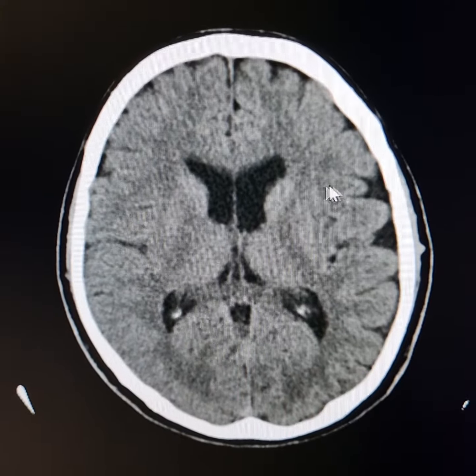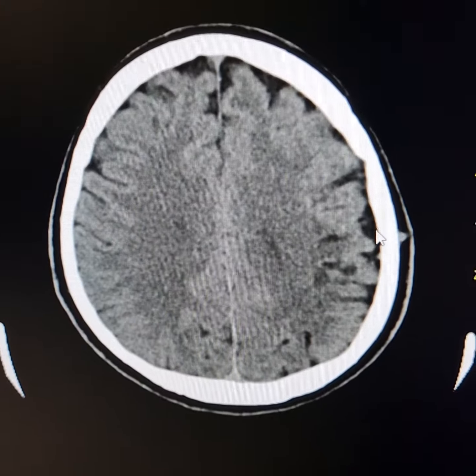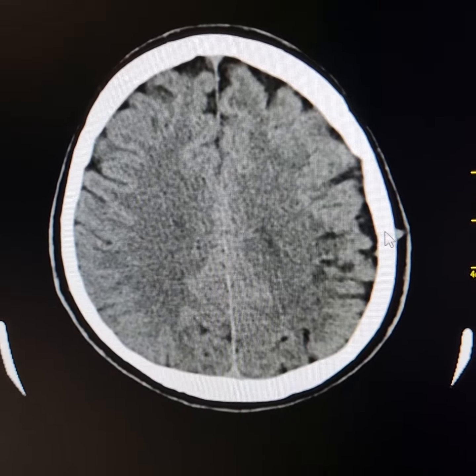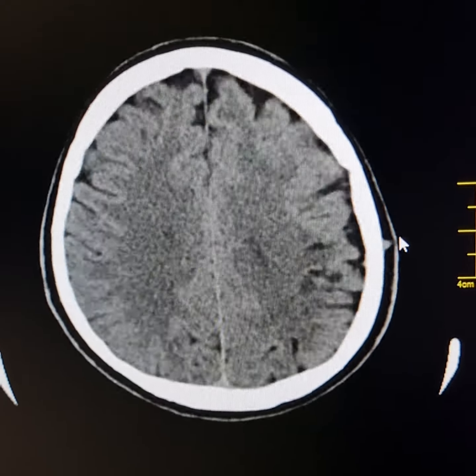This is relatively wider. Now this is the central sulcus here. As I go up, sulci, they are widened while gyri are thinned. This goes up to the vertex.